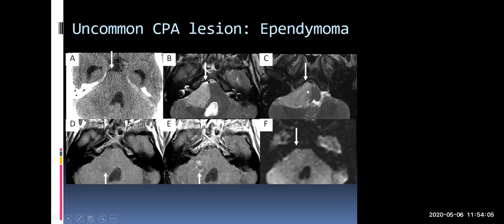And you can see on this T2 image, the tumor is actually coming from here, but instead of growing into the CSF space of the spinal column inferiorly, it's growing into the cerebellopontine angle, and was confused with an acoustic neuroma and a meningioma. But you can see from its enhancement pattern, it really doesn't enhance at all. It has a very diffuse pattern of enhancement, and it's fairly isointense to the brain, with nothing on diffusion. And the only thing that looks like that is an ependymoma.